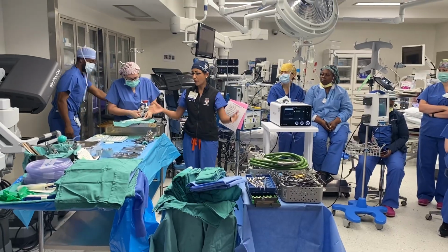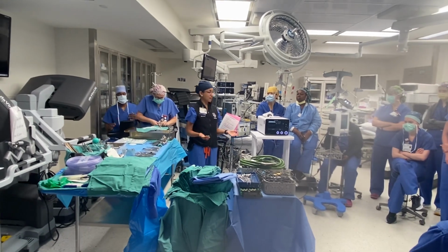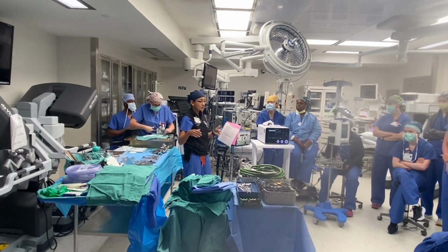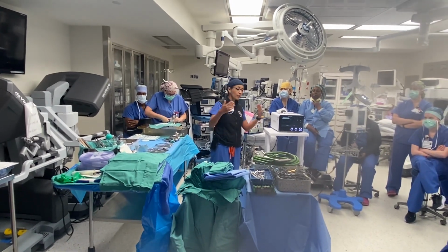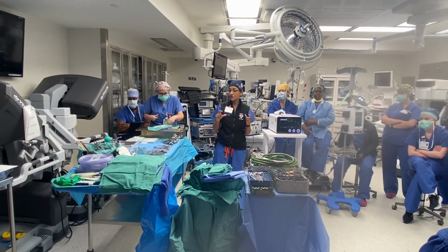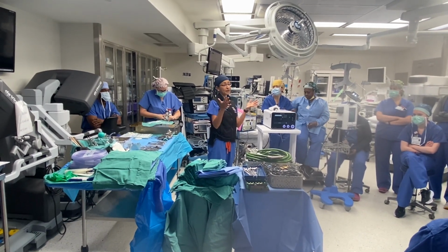Set up. We have a mock crani set up here, and I'm just going to go through the rhythms and routines of what we do. We'll think about it as an emergency case where we're coming up to the OR for a stat crani, and then I'll also speak to some of the nuances for an elective tumor or something like that. So these are cases typically for the emergencies.